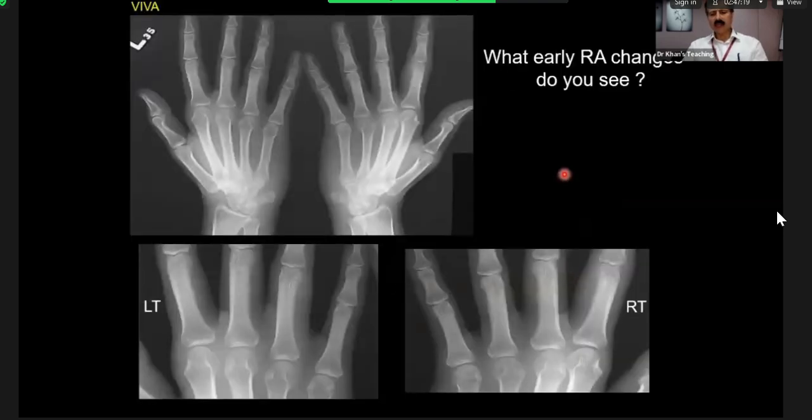Okay, candidate 1. This is a known case of RA. Can you describe your findings for everybody?